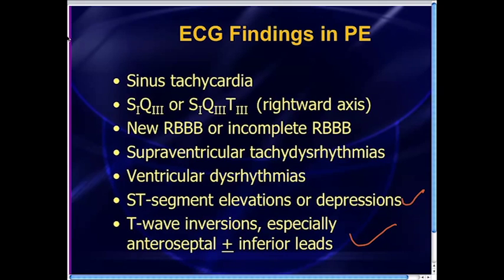And this is what I actually want to talk about in this brief segment, because flipped T-waves, I think we've all learned flipped T-waves equal cardiac ischemia, and it's very rare for people out there to teach that flipped T-waves are actually not specific for cardiac ischemia. Flipped T-waves, in fact, are very common in cases of large PEs.